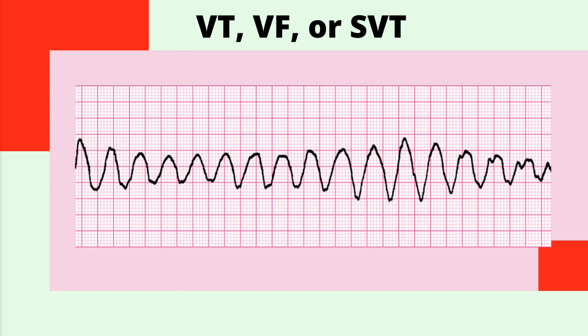What were you thinking? If you said VFib because it doesn't look super symmetrical, okay, but there is some symmetry here. So this is a VTAC, and I would even go as far as to call it a polymorphic VTAC. I would not, however, go as far as to call it torsades de pointes. We don't really have that pinching, right about here where it's the smallest. In true torsades, that should be almost like 0. You should really see it pinch down to almost 0, and you don't. So this is just a polymorphic VTAC.